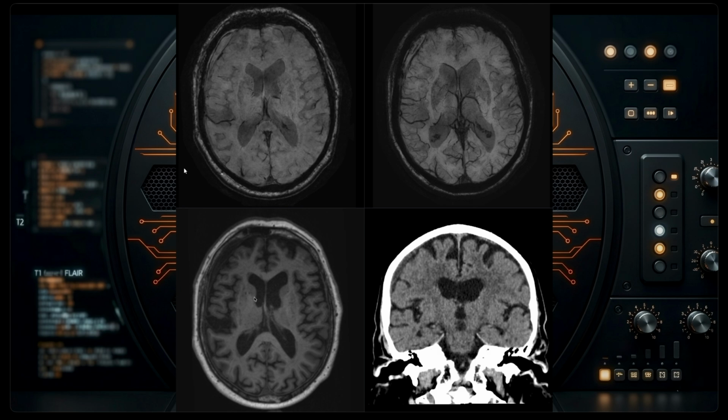And here we have the correlation. All the images are from the same patient, of course, on the T1 weighted sequence, as well as the coronal CT computer tomography image. Here we also see a little bit higher density of the chronic subdural hematoma. This is a cortical vein compared to the normal low density of the CSF.